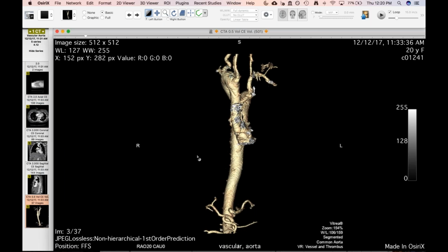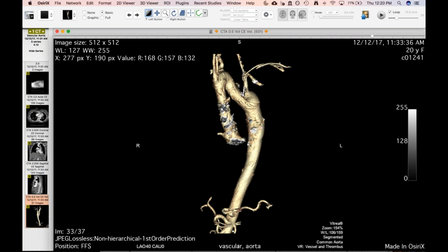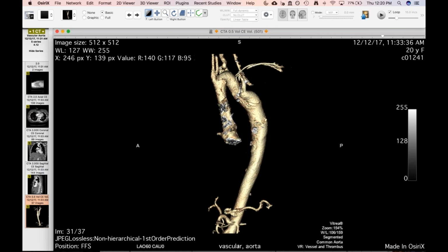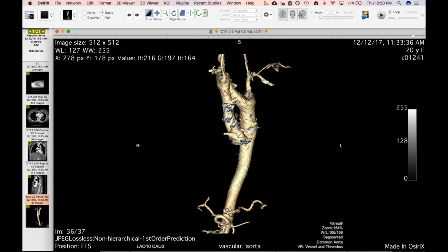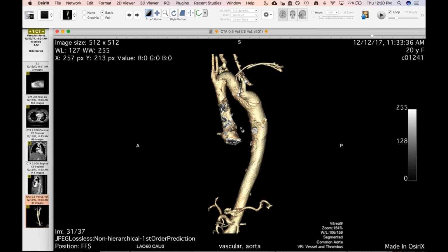But they had referred her for potential surgery. They wanted, I don't know, she has other issues too, to correct her vascular ring here, but it's such a complicated arch, and she has other issues that the surgeon deferred. But you can see how high the arch is. So very similar morphology to the one you showed a couple of weeks ago. Very cool.